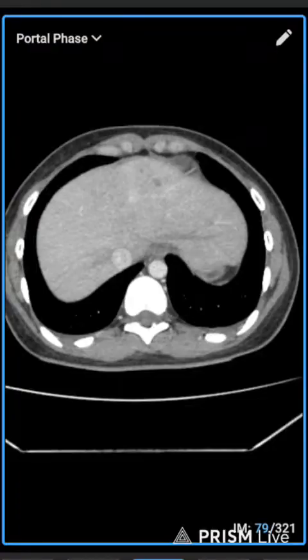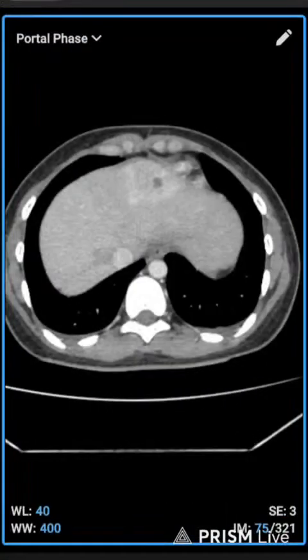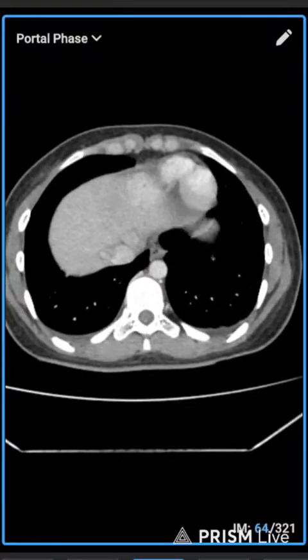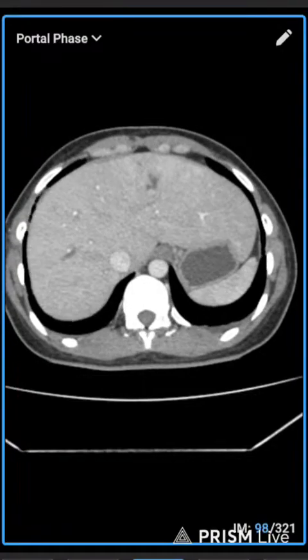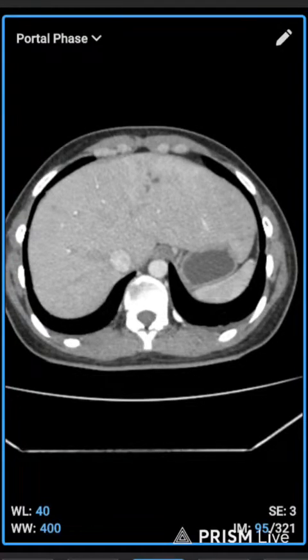The outline will be sharp in this phase, so wherever you suspect a liver tumor, you have to do the triphasic scan. In this scan, the tumor area will show properly, enhancing the outline of the tumor.